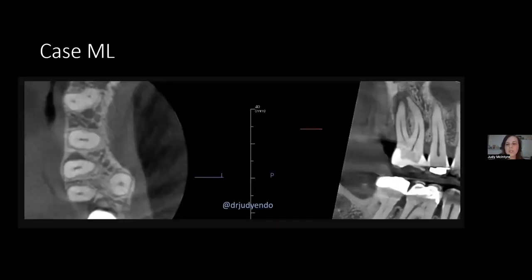So what is this going to look like, and how can this help you discern from cracks? Number one, we can transilluminate it, and I'm sure that the whole tooth would light up. There would not be a disruption in the light. Number two, we have a cone beam. So we see the periapical lucency, and then we very clearly see the lateral lucency. And if we squint even harder, you can see a faint kind of oblique line, which is a canal, and then another faint one right here.